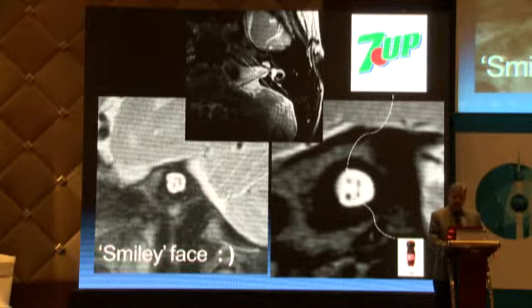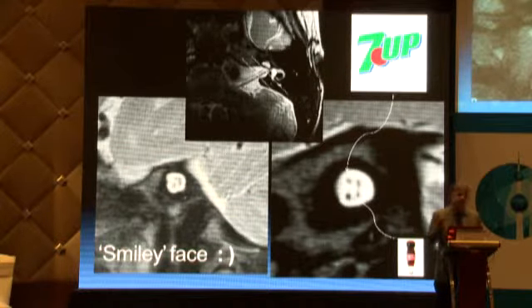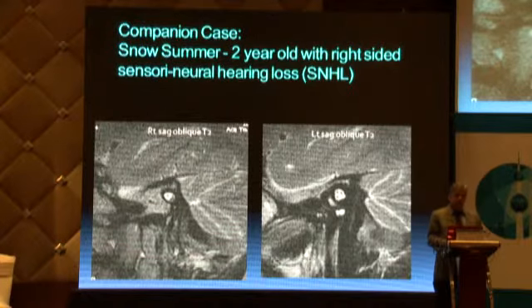So in that case, you could see that the facial nerve was missing and that was facial nerve hypoplasia, but we apply the same principles to hearing loss and you can pick up cochlear nerve hypoplasia. So if you look at the right sagittal oblique, the cochlear nerve is missing over here, facial nerve is present. So usually we evaluate this for cochlear nerve hypoplasia.